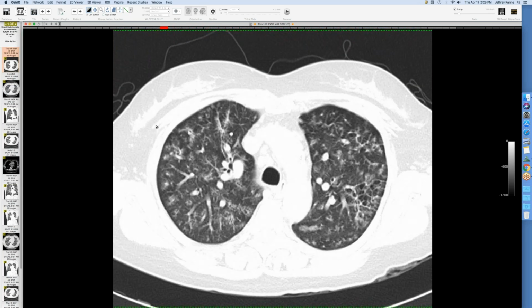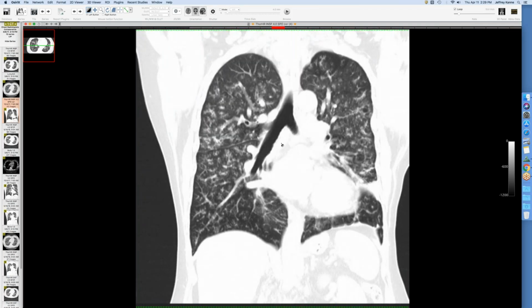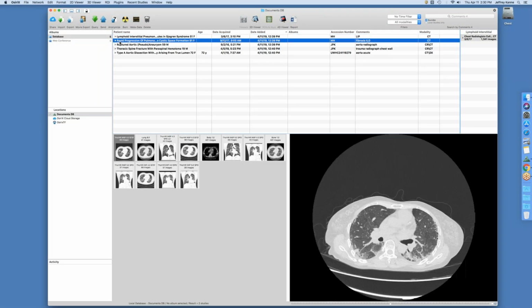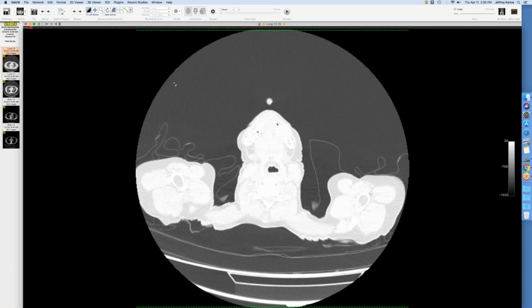But I think it's just a pretty example of this. I'll put up a MIP, I mean, a coronal image, and it's been stable over a few exams. But it's not always cysts and nodules. I saw a case like this the other day, which when I get everything together, I'll show, because it's quite similar to this. So I think my patient, like this one, has florid LIP, and then the cystic spaces are the consequence of the deposition of immunoglobulin-associated light chains and the cystic spaces that result from that. Okay. And then this one is florid.